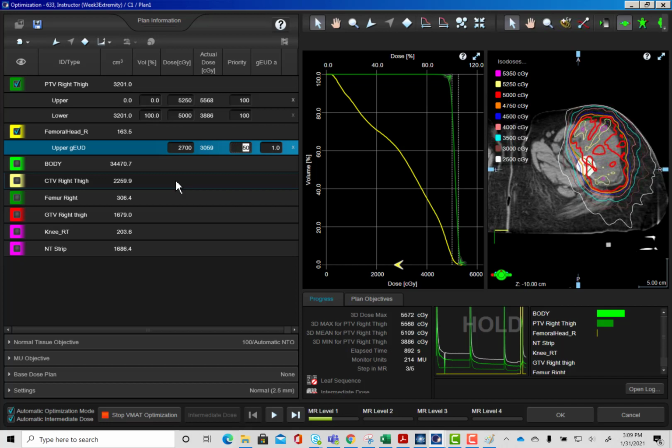Let's make a little bit bigger jump, 27. So for time constraints, I'm just going to leave it at 27. It definitely looks like it's going to struggle a little bit more with 27, but over time it should kind of come down.